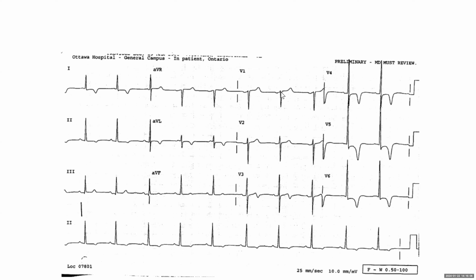Can we code, oh, I missed this. Can we code LVH by voltage and ST? I think so. Yeah, I think so. Sometimes they add new codes. Oh, okay, good to know. But probably the majority are old. So if you're familiar with these ones, I hope it doesn't make a huge difference. Okay, any other questions about this ECG? Yeah, okay, excellent.